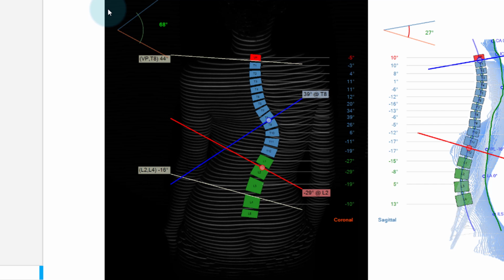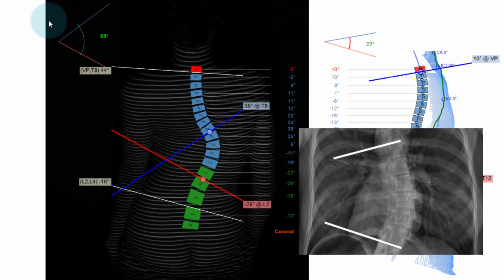The difference lies in the consideration of the skeletal formation. When determined by an X-ray, the concrete structural situation is present: deformed end plates, wedged vertebrae, etc. This morphological damage cannot be captured by the video raster stereography and is therefore represented in the model by a morphologically intact bone structure. In addition, DIERS performs a three-dimensional view and always orients the drawn tangents to the segmental rotation as well, a circumstance that is impossible in the radiograph. For this reason, the DIERS scoliosis angle and the Cobb angle must have different characteristics. Due to the variable morphology, a standard offset factor is also not possible.